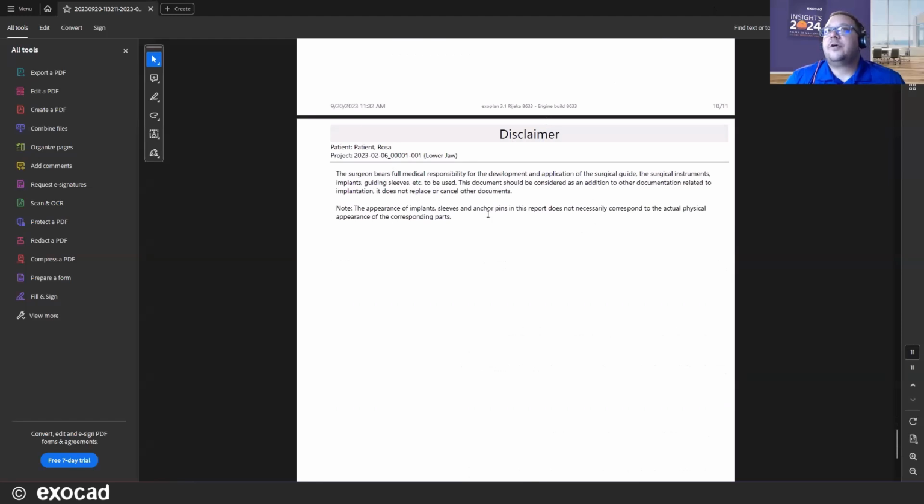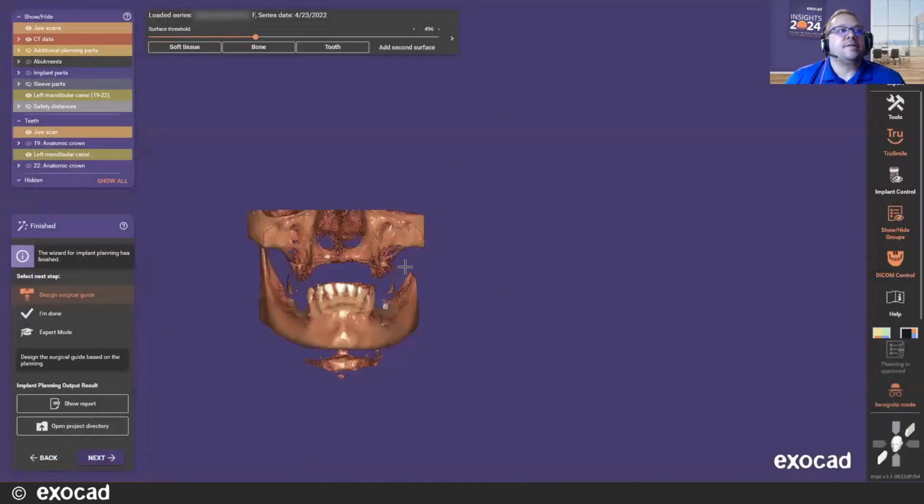And then a disclaimer at the end. And we'll go ahead and close out of this. So our next step here, I'm going to go ahead and move forward to design surgical guide.